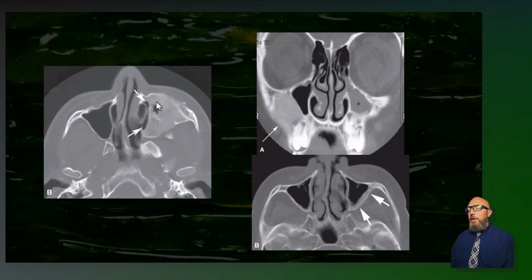All right, hopefully you're starting to appreciate the appearance. When you see this and it's just kind of a moderate gray value, we'll typically describe that as ground glass. So this ground glass appearance filling the sinus, it's a little more hyperdense than just soft tissue or fluid.